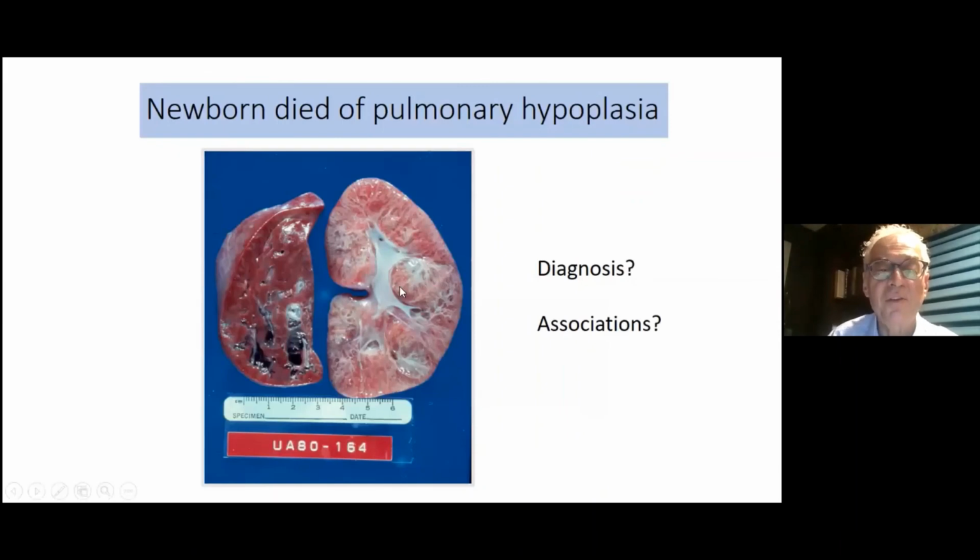And if you look at this autopsy, also of autosomal recessive polycystic kidney disease, they're big, huge, spongy kidneys, and they have what in the liver? Periportal fibrosis. So this is autosomal recessive. We used to call it infantile and adult type, but as I showed you, you can have adult type, or autosomal dominant, in newborns, and you can have infantile. I didn't show you a case. I have a case of so-called infantile or autosomal recessive, presenting mostly with liver findings and not kidney findings.